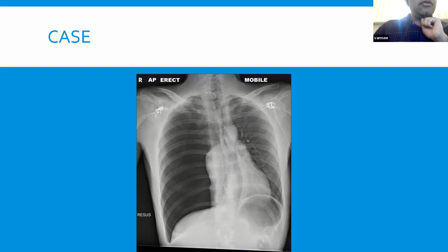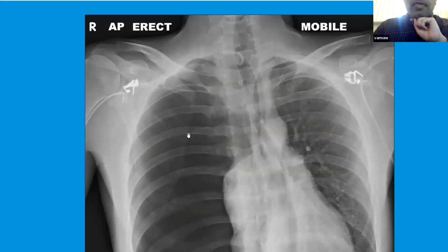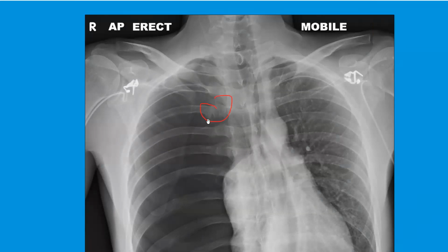High on the fracture on the right side. So bear with me. I'm not sure I can. Are you talking about that bit, Ellie? Sorry, I've just circled it because I thought that was a fracture.